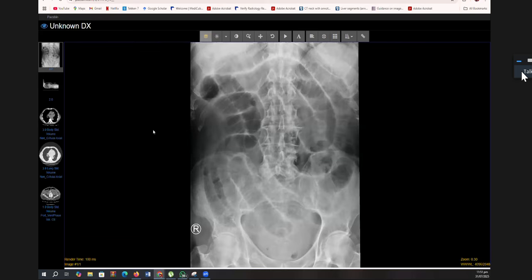I'm presented with an X-ray abdomen, in which I can appreciate dilated bowel loops, and these are likely small bowel loops, as I can appreciate the valvulae conniventes. Then I would try to look for the cause on this provided plain film.